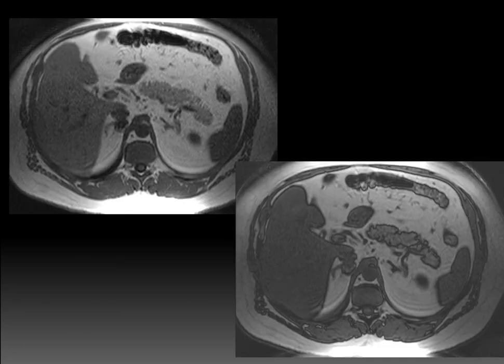So an MRI was done, and you can see on the above in-phase image, the nodule is posterior to the inferior vena cava, and on the opposed phase T1 weighted image below, there's not really any signal dropout. In fact, the nodule actually looks darker on the in-phase image, not the opposed phase image. So this does not help. It doesn't characterize the nodule.